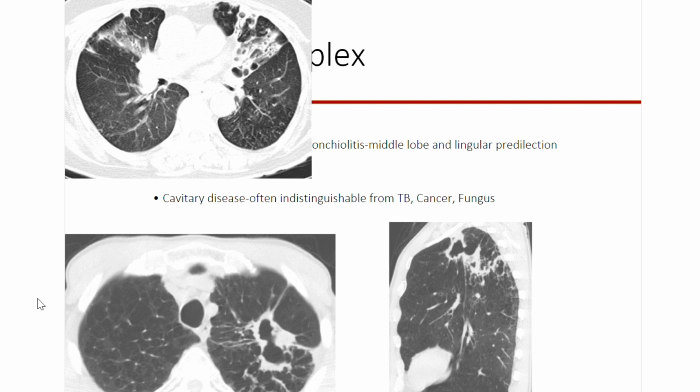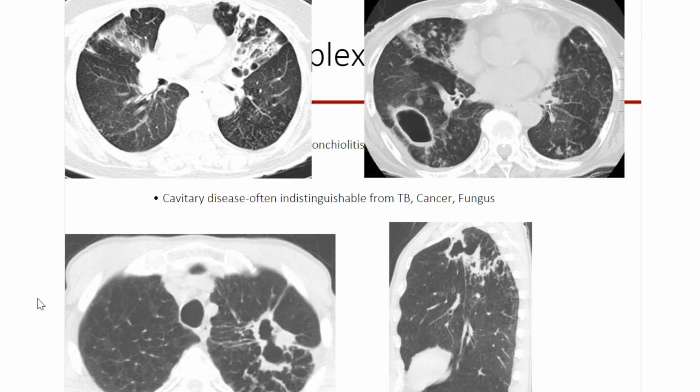You can see what he was doing, right? How many times do I see this? And it's not cancer. But this turned out to be MAI, and that's fine, great for the patient that it wasn't cancer. But look at this patient. This patient had a history for 20 years of MAI, the non-classical form, bronchiectasis, tree and bud.